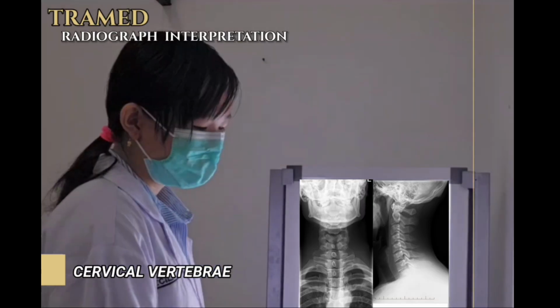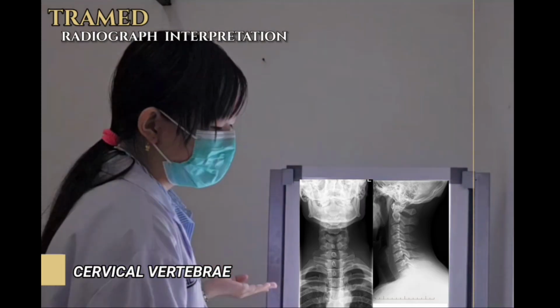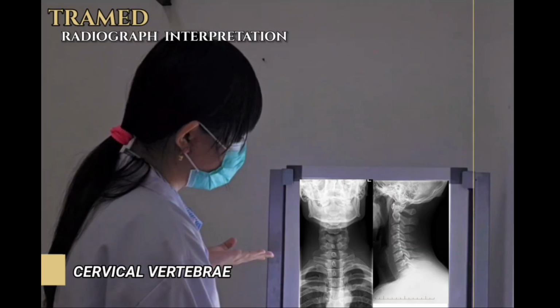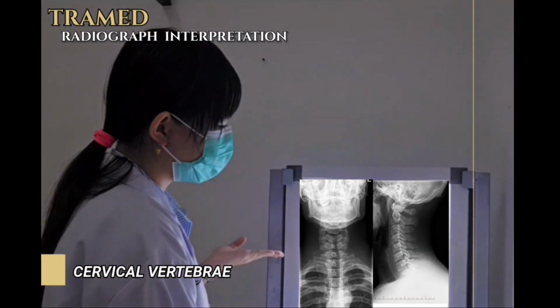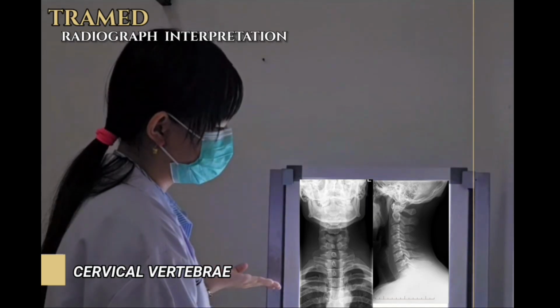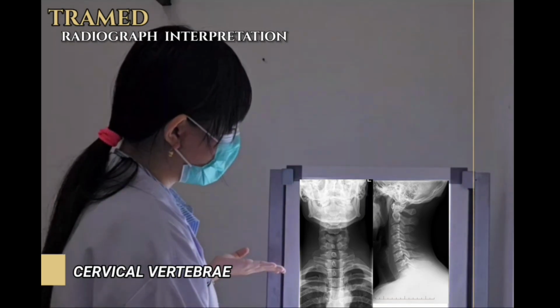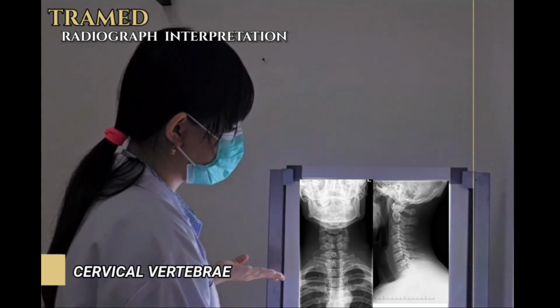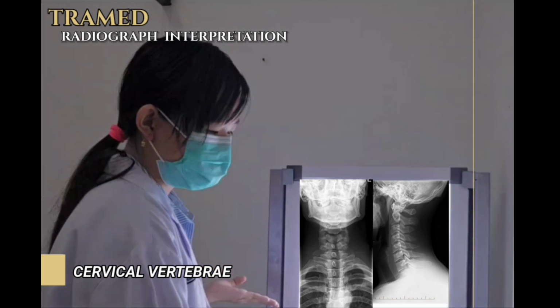There is no fracture. The bone density is normal, no osteoporosis, and the pedicles are intact. And for the next, there are no signs of fracture, destruction, or lesions. There are no bone spurs, and the intervertebral disc space and foramina are normal, so it's normal.